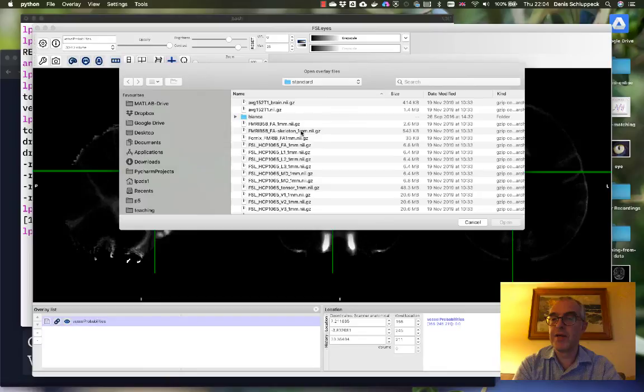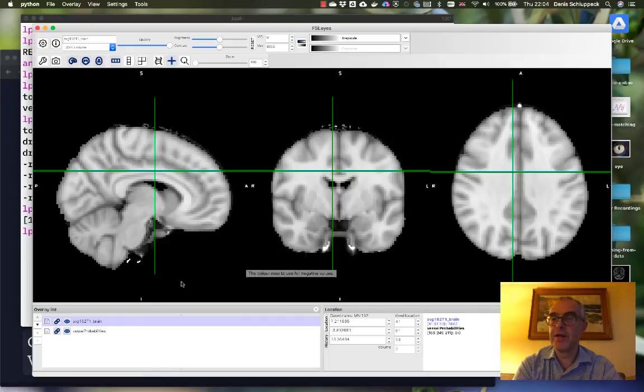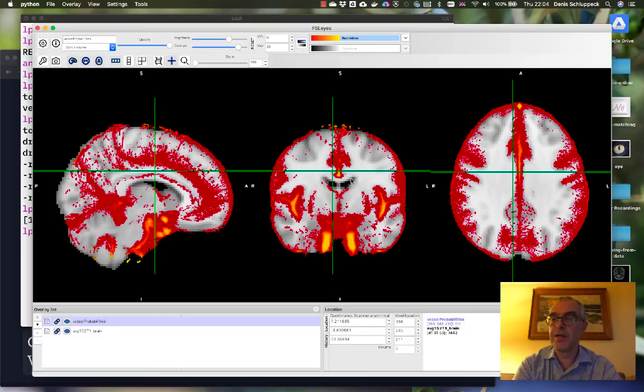which lands me in the standard brain. And so just to see whether this actually works for this particular image, so this is collected in a completely different setting. I'm going to move it to the bottom, okay, and I'll change the vessel probabilities to be displayed in red.